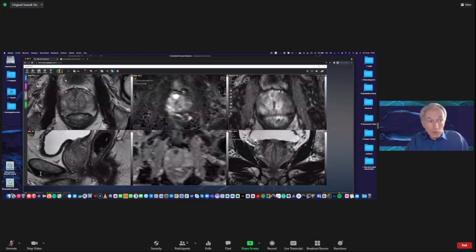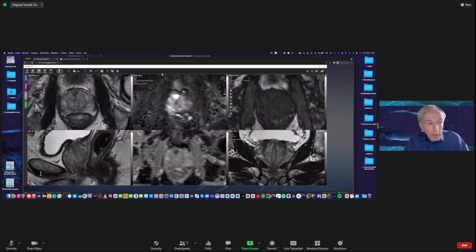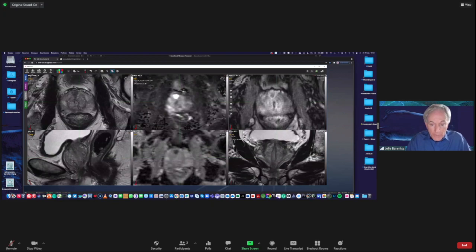So, I will come to the end of this second patient, and I think also at the end of my workshop. And I would like to show you the results of this patient. There were no signs of extraprostatic disease. So this is a 4 and a plus, which yields a 4. And on biopsy, it was a Gleason 4+3 and a 4+4 with cribriform growth. So this is a very aggressive one.